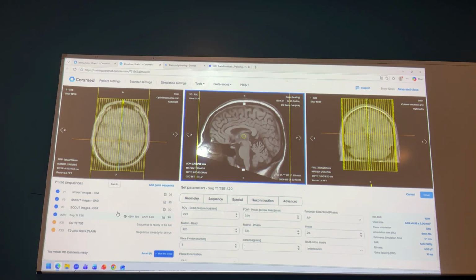Good? Any questions on the worksheet? And then when you are drawing your images, make sure to include the slices. Okay? For example, for this one that I ran, for the sagittal, I decided to draw the axial. I draw this image and then include a few slices on it.